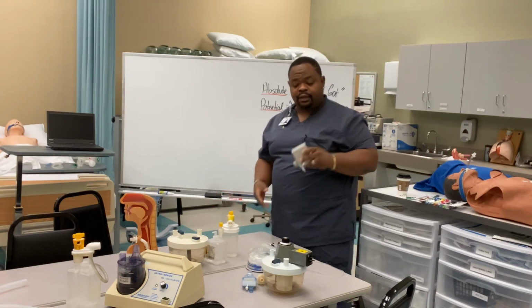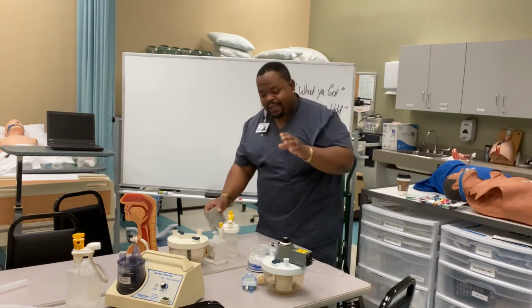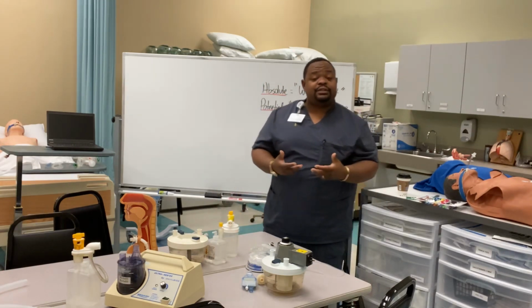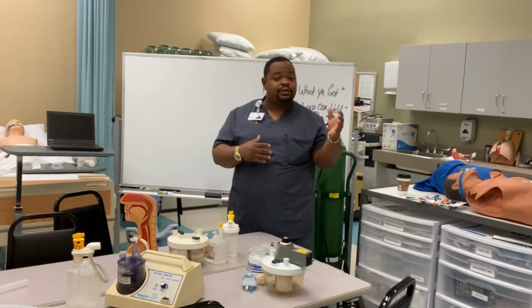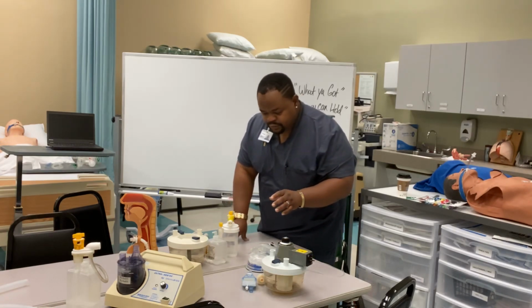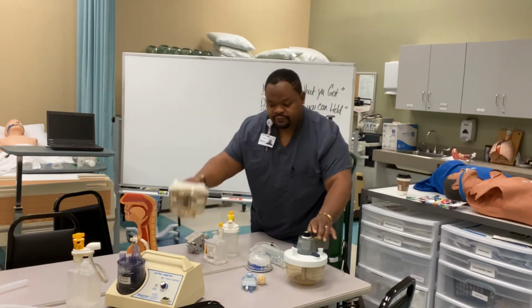It may be broken. So you want to always keep that analyzer backed up to make sure that you are giving the oxygen that you need, because FiO2 is very important. Very important. It can be good and can be what? Dangerous. All right? Now, so that's the Cascade. This is the Passover humidifier.